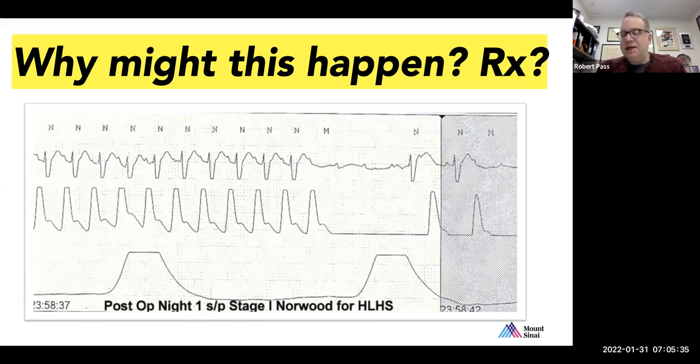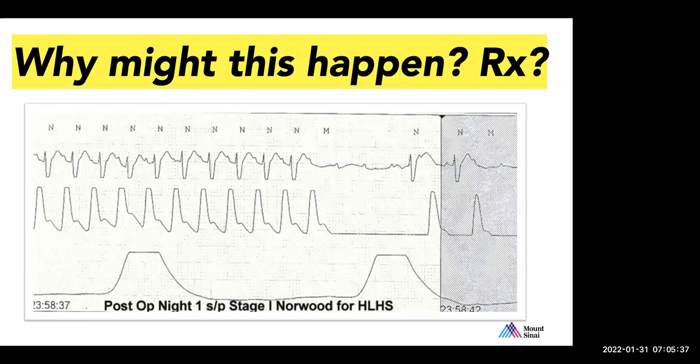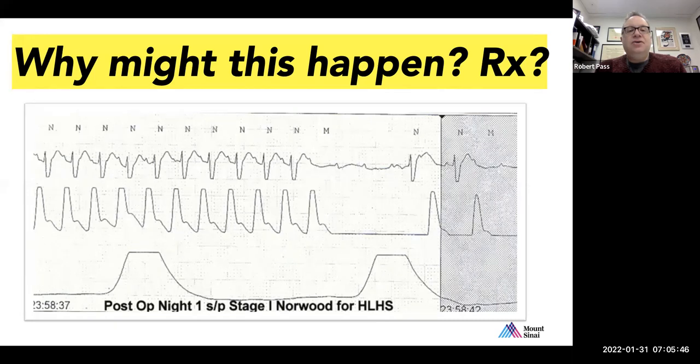Typically, it's not a guarantee, but I'd say the His-Purkinje system. Yes. Mobitz 2 is usually at the level of the His-Purkinje system. Not always, but you would need a His catheter and an EP study to know for sure. But yes, usually this is some kind of His-Purkinje disease. So this is some kind of Mobitz 2, second-degree heart block.